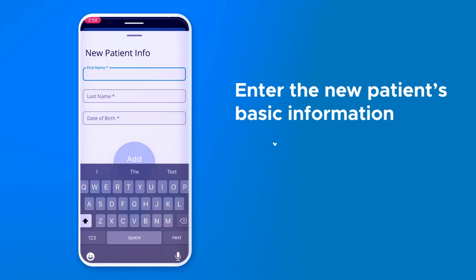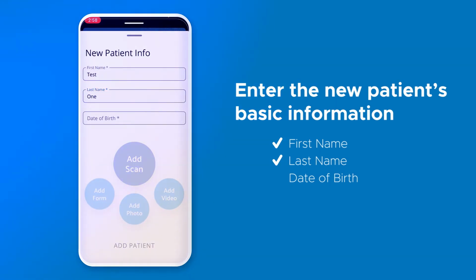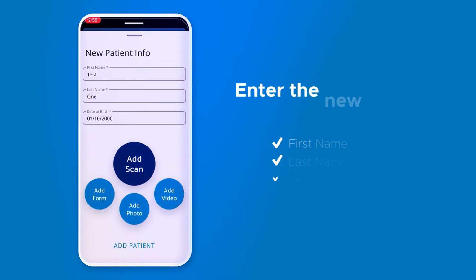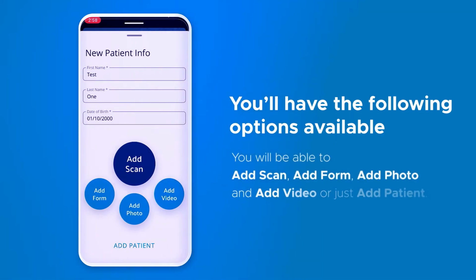Once you enter the new patient's first name, last name, and date of birth, you'll have the following options available. You'll be able to add a scan, add a form, add a photo, add a video, or just add patient. For this example, we'll just select Add Patient.